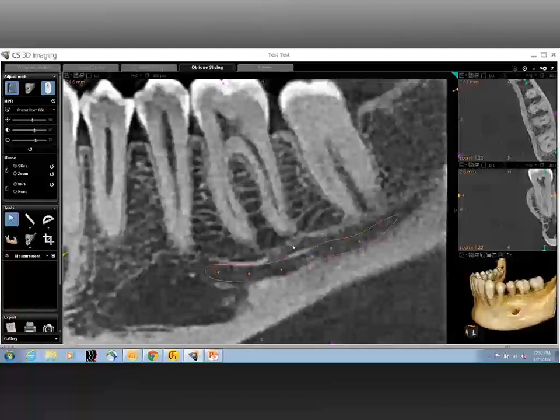These are very important. Now, I understand dentists are interested in visualizing the PDL and PDL-related structures. So which are the most common non-implant related findings commonly visualized in scans of the mandible?